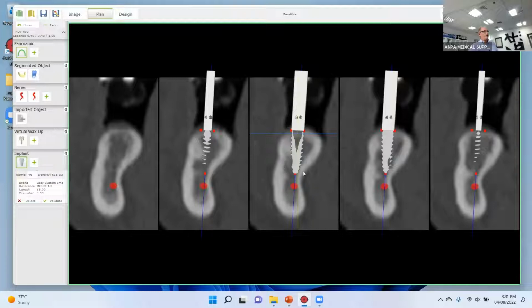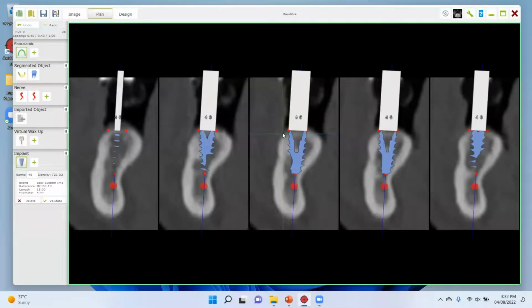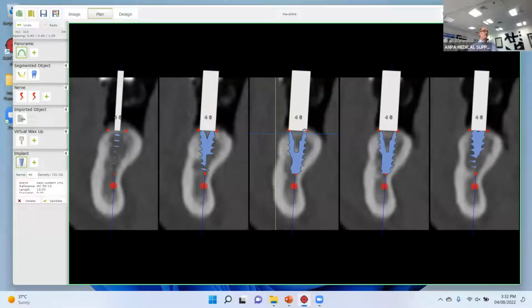The color is changing because I decided to use the international coloring system that you have in endodontics. It is white, and then it changes to yellow, blue, and dark. Okay? So based on your system, you will know immediately what the difference is.